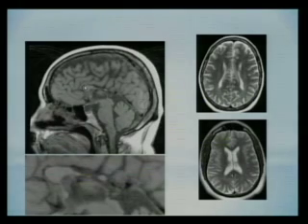You see the anterior portion of the corpus callosum is formed, a little bit of the body, and then nothing. And the way the corpus callosum is formed, it is from the anterior genu to the splenium, and then the rostrum is last.